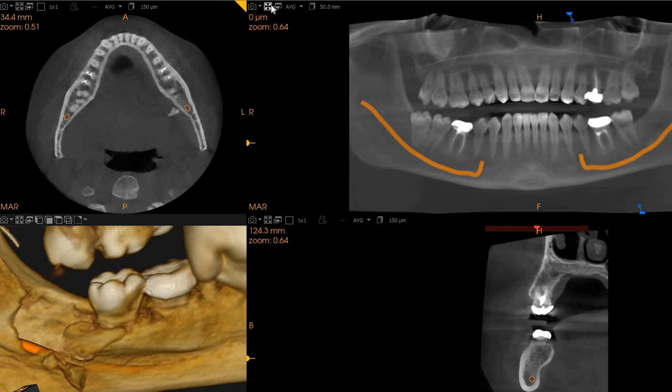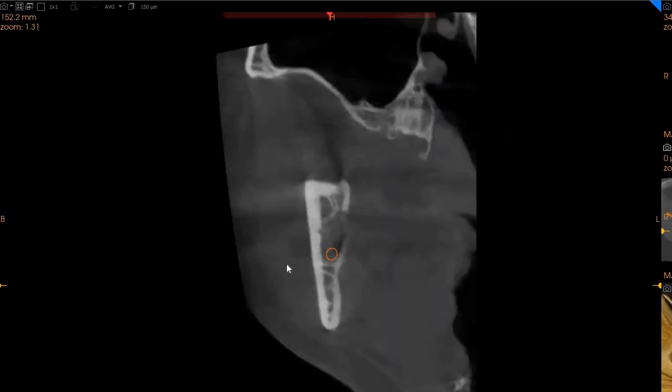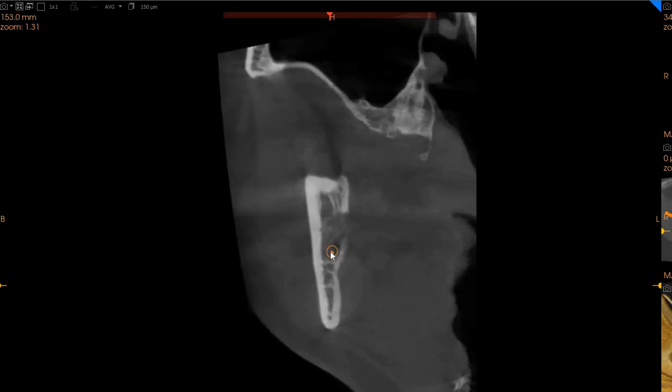Today, on the special request of the patient, we're making another video, even though we've clearly identified the area on the lower left, which was previously mentioned. But now that we know the symptoms of the patient in the clinical, the reason why the patient is suffering from numbness is because here you can very clearly see that the inferior alveolar nerve was in very intimate contact with the impacted wisdom tooth, and here you can see this radiolucency, which identifies where the tooth has been extracted, and this is where the nerve definitely got compressed at the time of extraction.